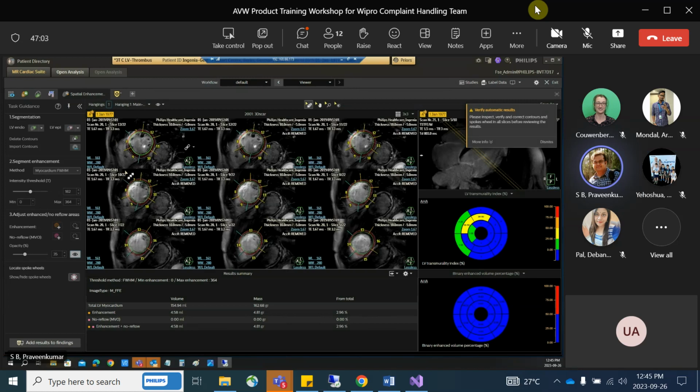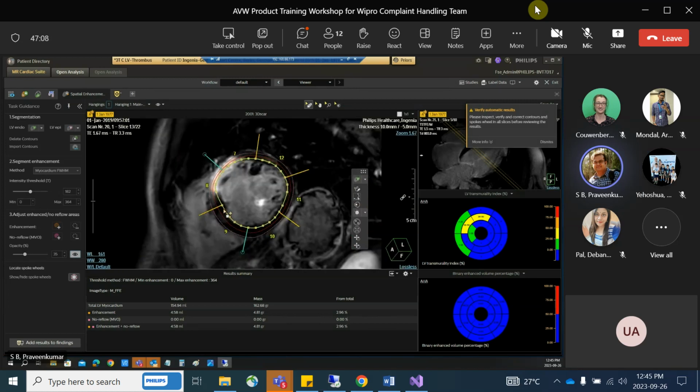This special analysis is just a study of the myocardium. As I said, is there any issue with the myocardium or any calcification? If some portion has died, it will not move properly. This is identified by the application automatically.